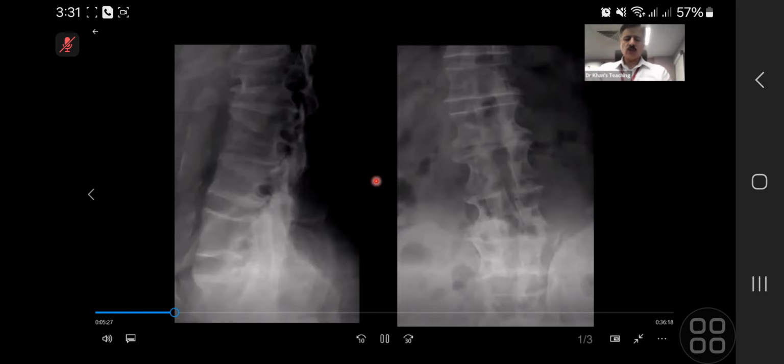Okay, so can I stop you there? You are considering neurofibromatosis because of the posterior scalloping, fine. But let me give you a hint. Look at the pedicles. So they're thinned. Or flattened, rather. Something else.